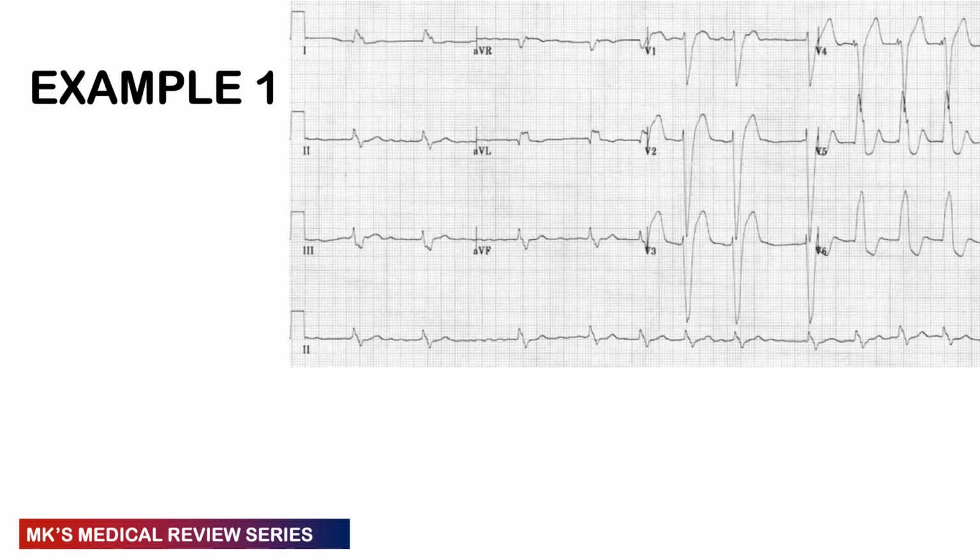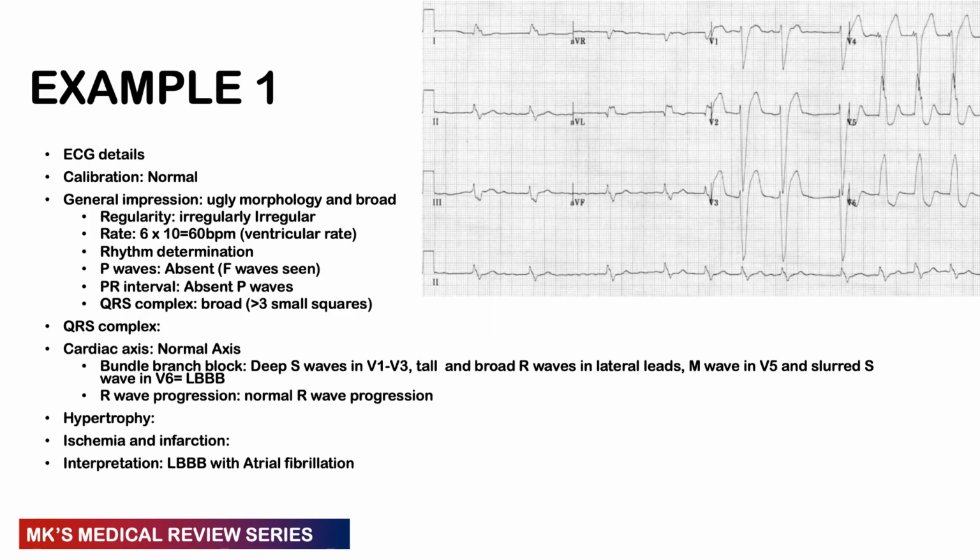So here's an example. I want you to pause the video and use the 6 or 7 steps that we have covered. I know we haven't yet talked about hypertrophy, we haven't yet talked about ischemia, but use the steps that we have covered so far to interpret this ECG and tell me your findings. You may pause the video right now, increase the quality on the video. And here comes the answer.